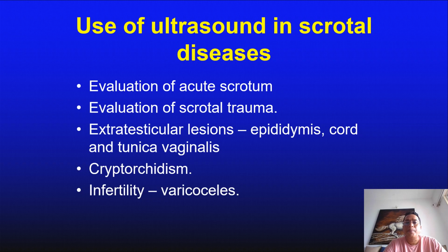Then failure of the testes to descend into the inguinal canal, and there can be references to search for these testes in cases of cryptorchidism.